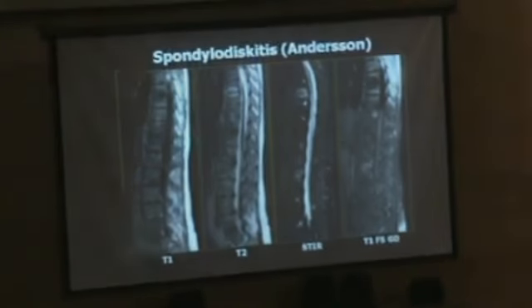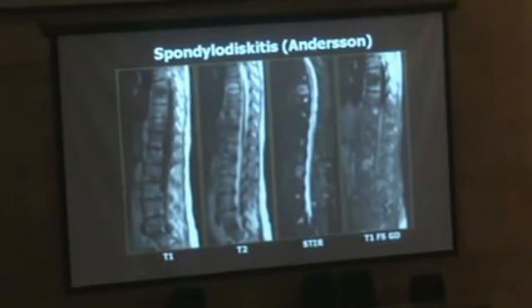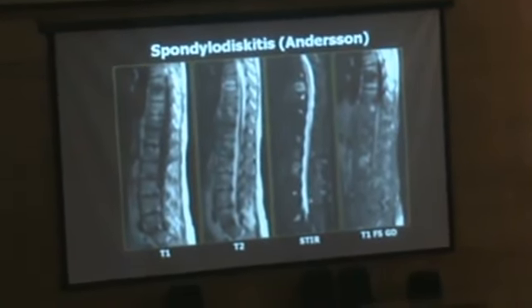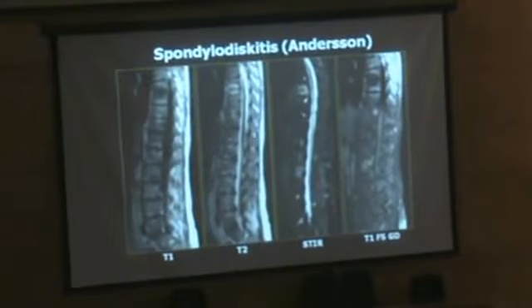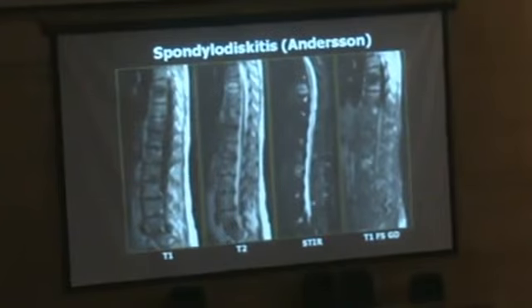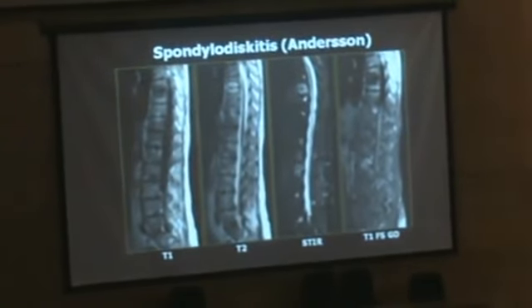I'll show you another example of the thoracolumbar spine to show you that in some levels we can have active lesions, and in other levels we can have chronic lesions. And that's the problem. Sometimes it's difficult to measure inflammatory activation. It is difficult to measure inflammation when we're following up these subjects before and after treatment.